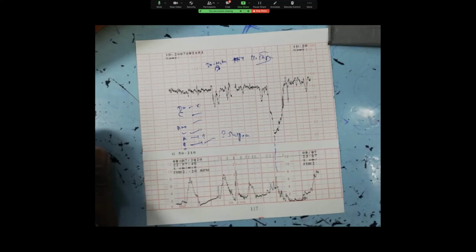Okay. Now let's look at the decelerations. So deceleration here, look, this is not a deceleration. Why? Because it is very thin. So it has not gone for 15 seconds. 15 seconds is what? It has to go about at least half the square of this. Half of this. Because from here to here, it is 30 seconds. From here to here, it is 30 seconds. This is 1 minute. So this one is very thin.